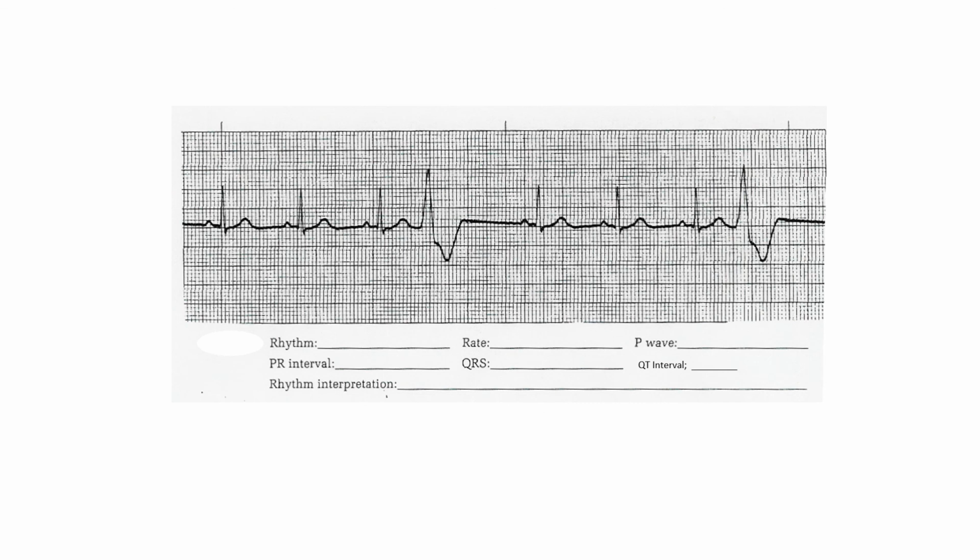These premature beats are wide, and the QRSs are in the opposite direction of the T wave, so therefore they are PVCs. They are happening every 4th beat in this strip, so you can call it quadrigeminy, and the PVCs look the same. So there's more than one PVC and they look the same, so we call them unifocal PVCs coming in at quadrigeminy.